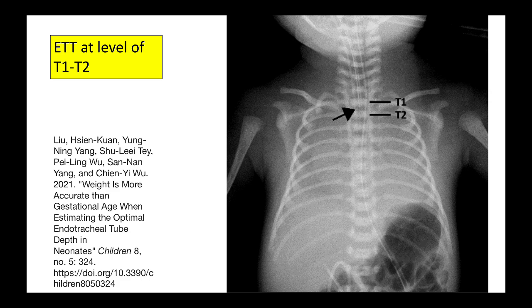So note here that the tube, if anything, looks like it's kind of at the level of the clavicles. So maybe initially you'd be like, this is too high, but more likely the way the x-ray was taken, the clavicles are lower than we'd expect.